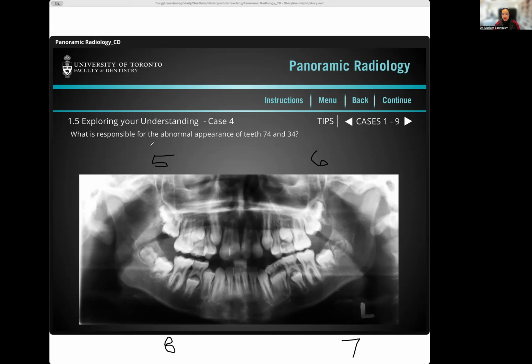So this quadrant right here, and of course, let's put in our other one because I know some of you guys are like me, and we get a little confused with these things. So for the adult, this is 1, 2, 3, quadrant 3, and 4. I never knew I was this useless with drawing with a mouse. All right, so 1, 2, 3, 4. So the question is 7-4 and 3-4.